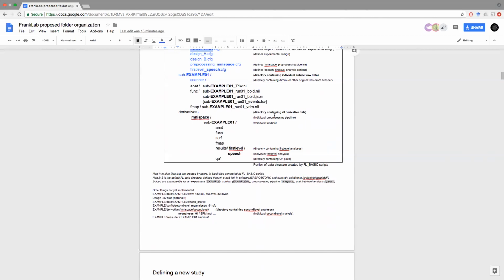And have you looked at just using the orig volume that is generated? So with FreeSurfer, there's an original volume that you provided, like a NIfTI or whatever, and then it does, I don't know if it does any processing on that, maybe some resampling, and you get another file that it calls orig.mgz.